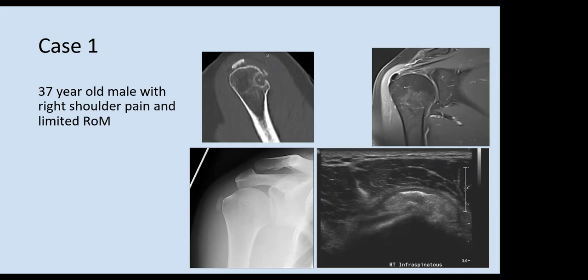Okay, yeah, thank you so much. Yeah, absolutely. You did really well. Normally, I would recommend you start with the X-ray. So I would describe this one as focus of calcification adjacent to the greater tuberosity of the humerus. And then you can move on to the ultrasound scan. You would say there's amorphous calcification involving the infraspinatus tendon.